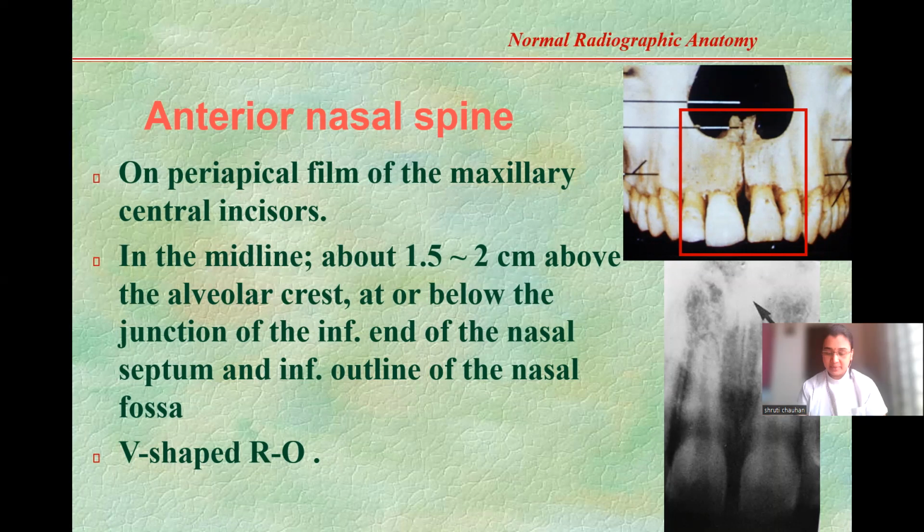What did I tell you last time? What is it? It is an anterior nasal spine. It is a projection. Just close your eyes. Think. यहाँ पर आपके nose के end पे there is a projection. There is an outgrowth of bone. ठीक है. Already maxilla है. Then उस पे थोड़ी सी और bone उठ गई है.